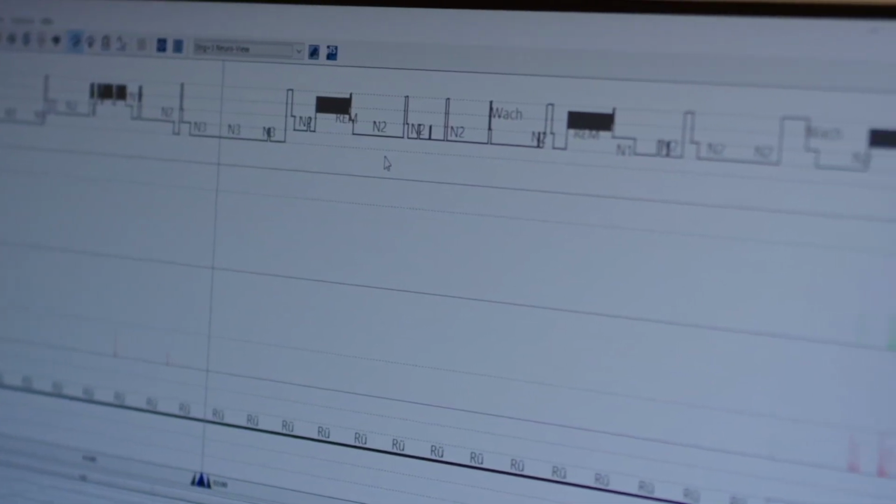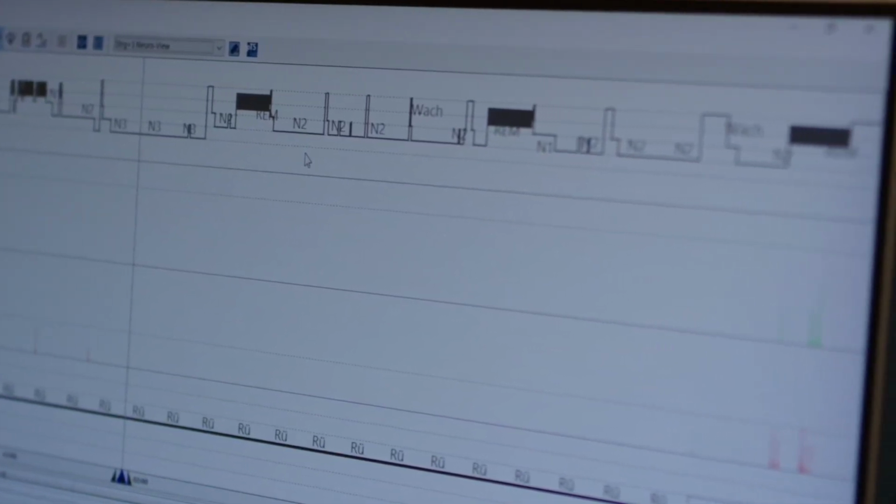Yes. So, of course, it's quite clear. We always call the individual sections a sleep period, so to speak, right? And we actually see with this patient, if I look at the bars for REM, about 4 sleep periods, which is also completely normal. So this is what normal sleep would look like. And REM sleep, it doesn't just get longer, Heike, but more frequent too. Yes, and more intense. You have more dreams. And how can you tell that the REM sleep is becoming more intense? That you can remember the dreams, but only if you stay awake for a while. You're probably familiar with the phenomenon.